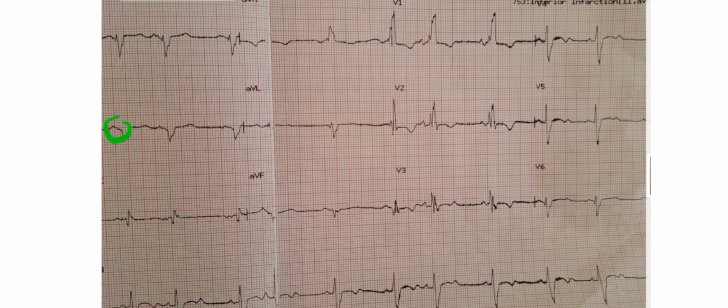There's a QRS complex there, P wave, P wave. Even on lead 1, this is our P wave, P wave, followed by a QRS complex, right? Even here on AVR, even though they are negatively deflected, the P wave is there.